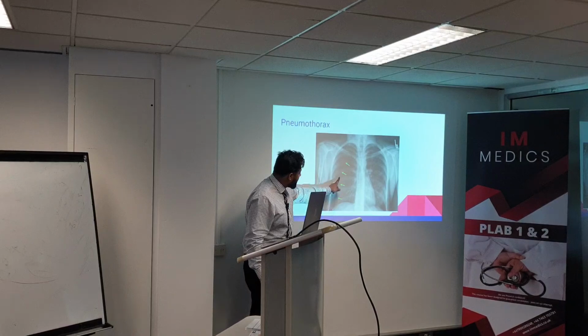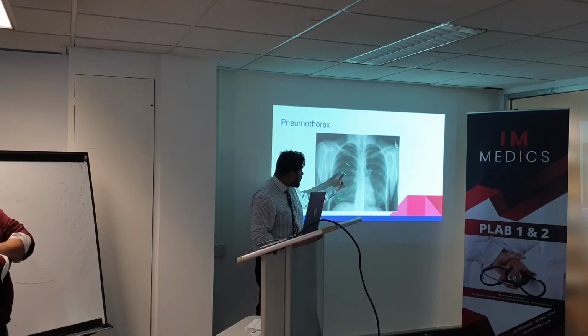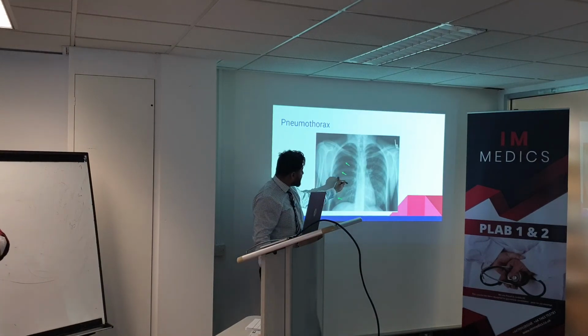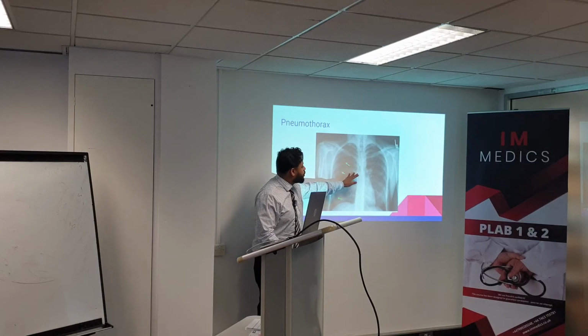And you see the line here, you will see one side. How do you know pneumothorax? It's easy. People think pneumothorax is hard, it's not. If you look at this diagram, if you look at the proper picture, you can see the line. Basically, you will see the other side will be pitch black, and this side will be normal color.